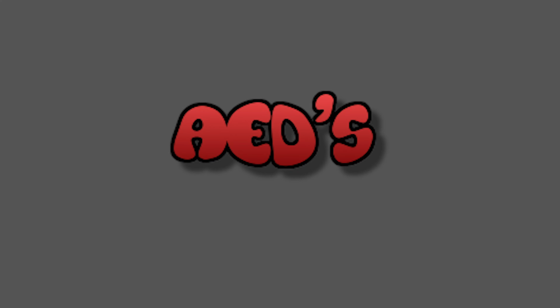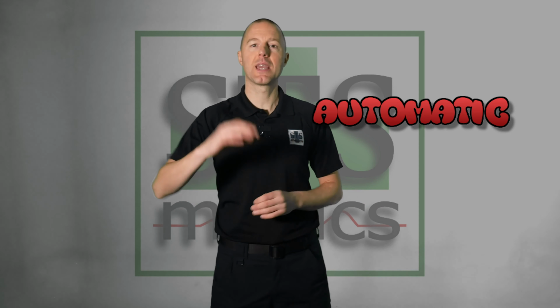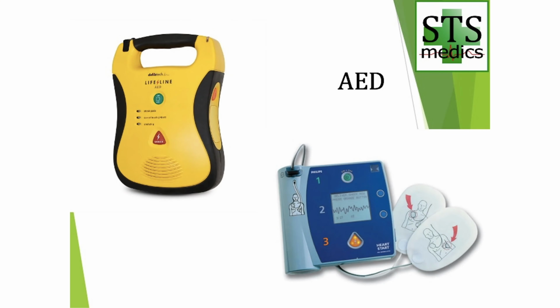This video is all about AEDs. AED stands for Automatic External Defibrillator, often called defibrillators or defibs. They are safe and simple to use. An AED is an important link in the chain of survival.